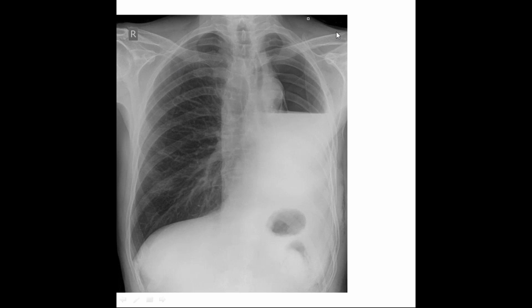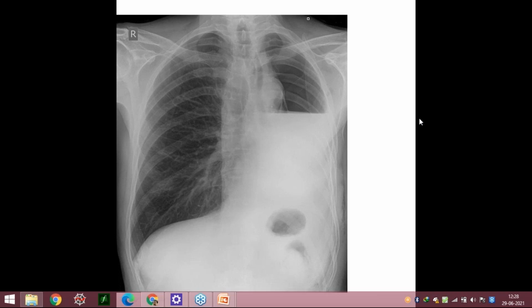Okay, now one more thing, which I would say is not a very characteristic marker. No, see, I would say on the right side, the markings are normal. I would not say that they are excessively prominent. In this region, you may say to some extent, but otherwise these markings are normal. It is absent on this side. That is why it is looking more prominent, but however, it is not that prominent.